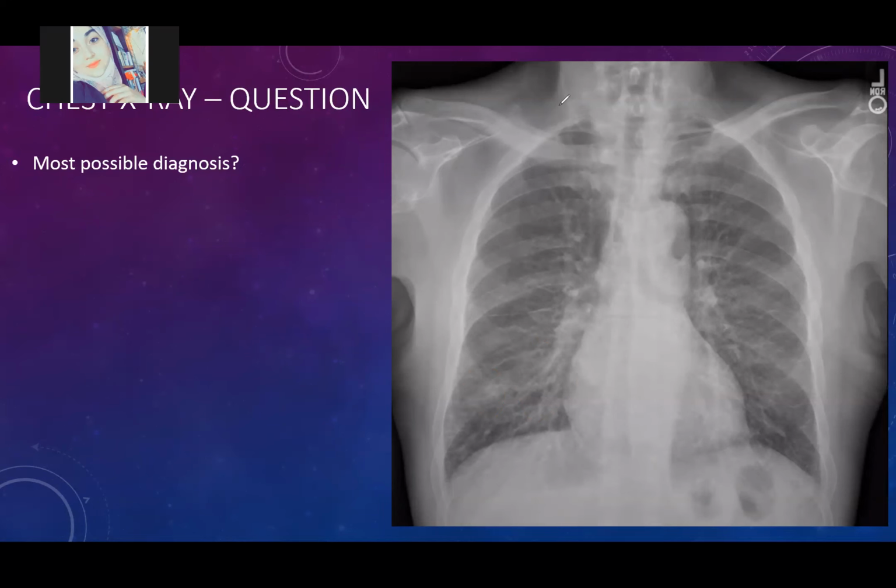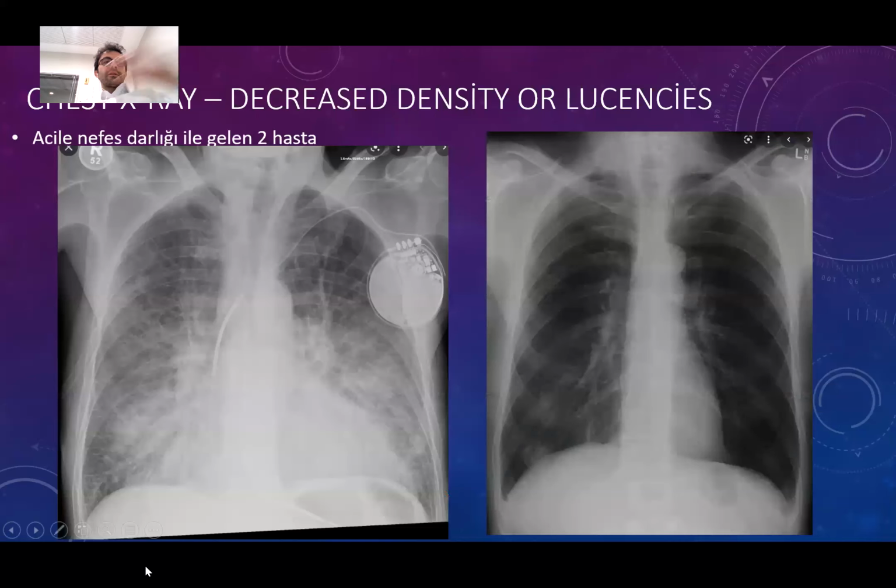Were you asking something else? So the key feature for heart failure is the Kerley B line? No. There's no distinction. Like, you look at this patient and it is a completely different picture, right? It's mostly butterfly edema in this patient. Edema on the central places, right? On the central space.